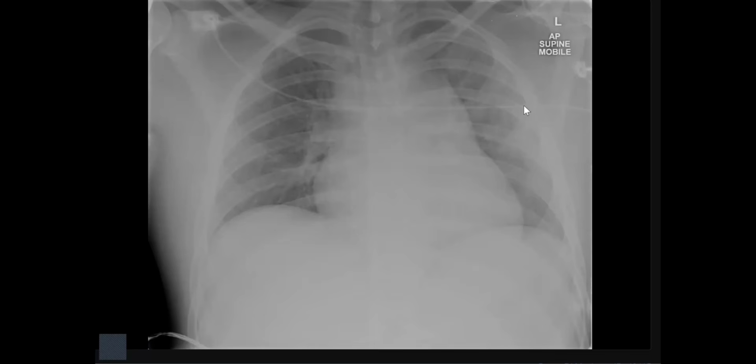In the case of trauma, it is suspicious for any mediastinal injury with mediastinal hematoma formation. I am concerned about any aortic injury or aortic syndromes in this case.